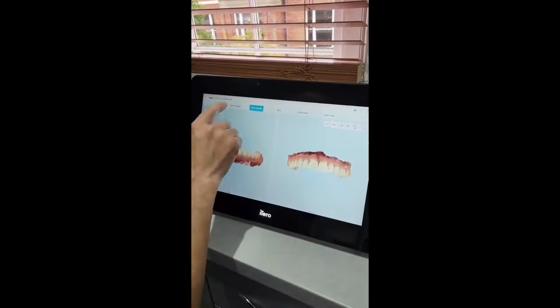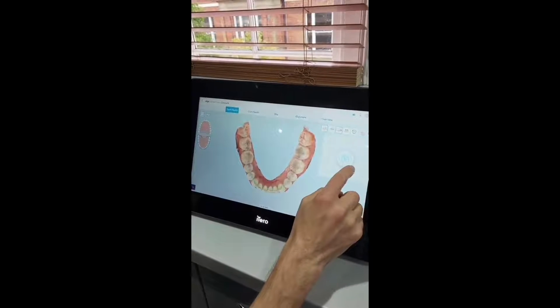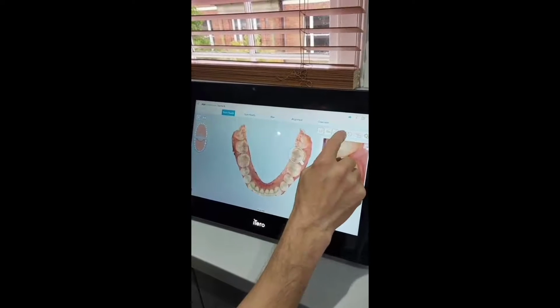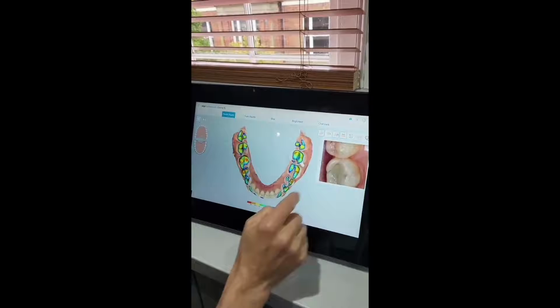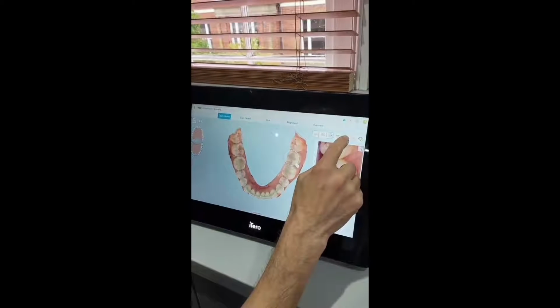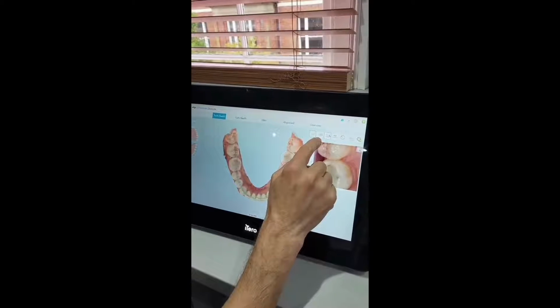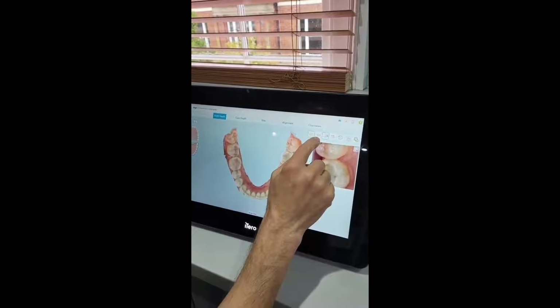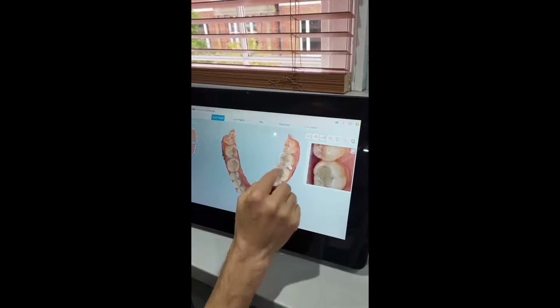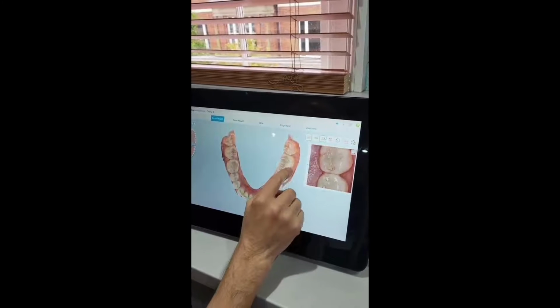And now let's look at tooth health. So it's the same sort of thing. You can look at the filling very closely. You can look at the bite on that filling. You can again compare the two. This one is NIRI, near infrared imaging. We don't have that facility open on this scan, but that would be another way that you could look at this. So you can look at all the tooth health very closely.